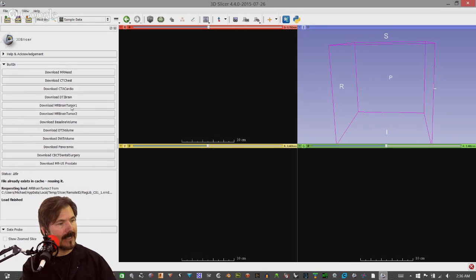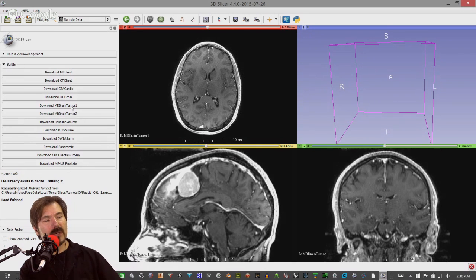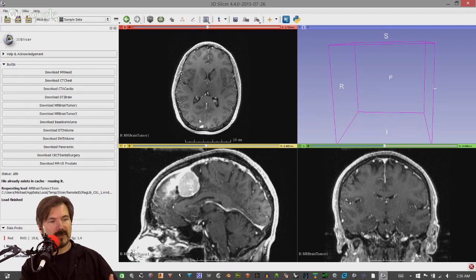All right, well, I'm kind of distracted a little bit, so let me focus back in on what we want to do, and that's bring in. And notice how quickly, and I think it's because I had it loaded already. Most of these aren't complete studies, so they do download very quickly. In this example, as we said before, we're looking at a top, side, and front view.